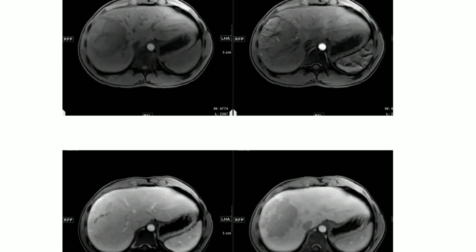And there have been a lot of studies on the difference between FNH and fibrolamellar HCC, and what sign we can rely on. And the scar was one of the poor indicators. So we should not rely on the enhancement of the scar. We should rely on the other parameters. And eventually we should evaluate all the features.